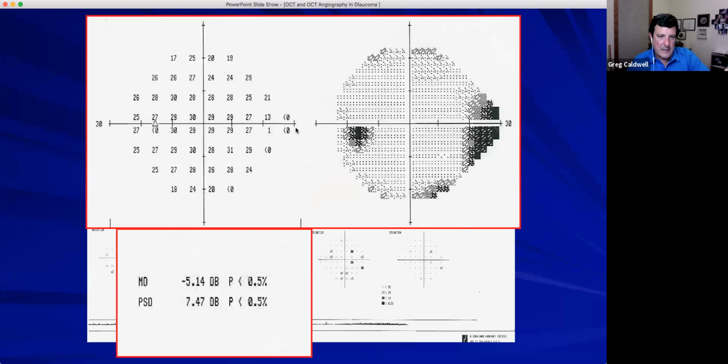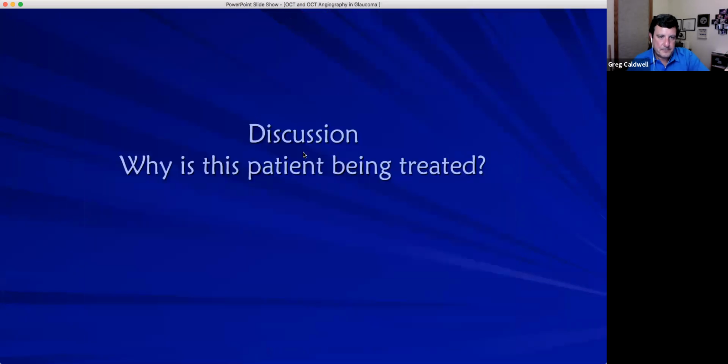Well, it's very localized because of this rim defect right here, because glaucoma usually doesn't go 27, 27, 29, 24, brightest light, brightest light, brightest light, brightest light being off. It's usually a rim or the trial lens that's blocking it. So this mild to moderate defect is very localized because there's a trial lens blocking the source of the light and the patient can't see it.